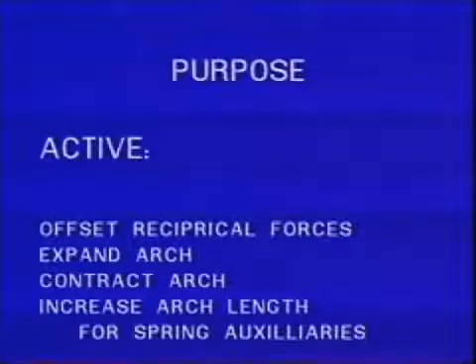A very desirable feature of the lingual arch is that it can be used as a site of attachment for auxiliaries such as springs and elastic hooks.